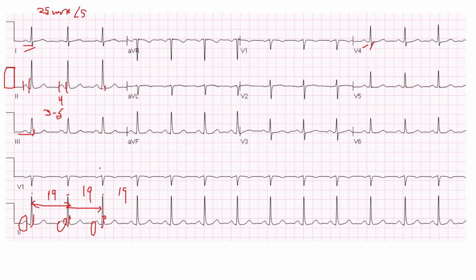The ST segment, you have to check almost every lead. For example, we said lead 1, lead AVL, V5, V6 represent the left lateral side of the heart. You don't have to check all of them. Check one or two, that's enough, because they all look at the heart from the left side. For example, let's look at V5. The ST segment is on the same isoelectric line. So there's no elevation, there's no depression, it's normal. Lead 1 is the same.